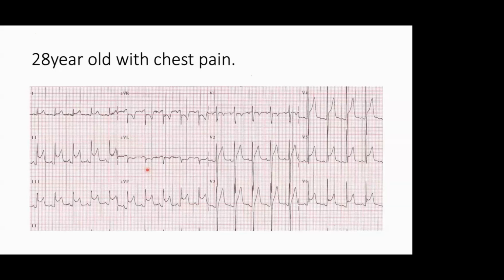So then you have to see all the other 5 points, whether it's infarction or not. Is it supraventricular? It's a tachycardia. It's not supraventricular tachycardia. It's sinus tachycardia only. It's P followed by QRS. Everywhere P is seen.